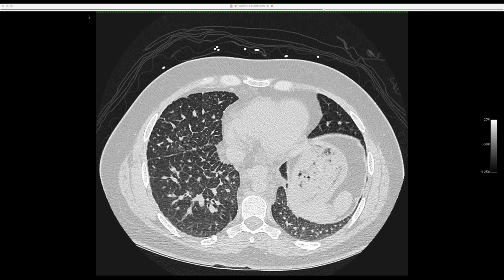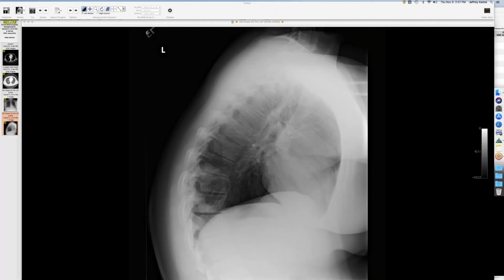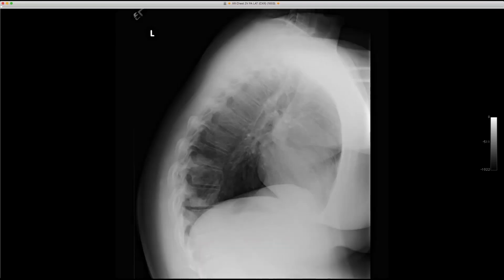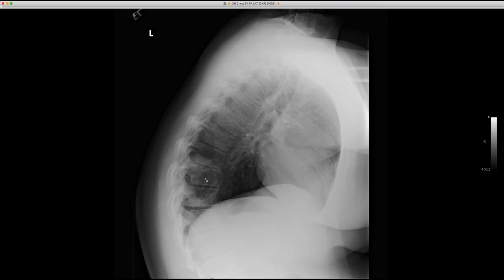So this was a young person who came to our emergency department with hemoptysis, and you can see there's this cavitary-like lesion in the left lower lobe. I'm still seeing the other case, Jim. Well, that's the old case. How is that possible? I don't even have it loaded. Okay, there we go. Well, here it is. You see it's in the left lower lobe, and here's a radiograph, but there's this mass-like area in the lower lobe with cavitation.